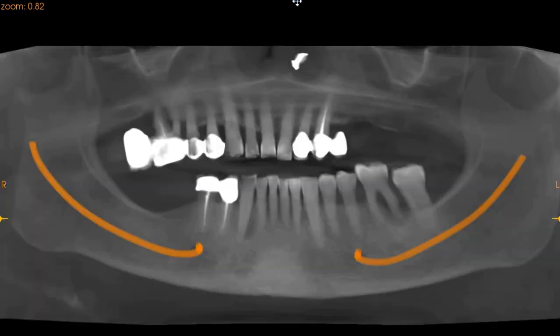Now moving to the central incisor on our left side, the central incisor right there. Sorry, just reorient it for you. There we go. So the central incisor in this region also has very faint canals present right here. It does seem to be periodontally compromised. We've got minimal bone support on the buccal as well as on the lingual side.